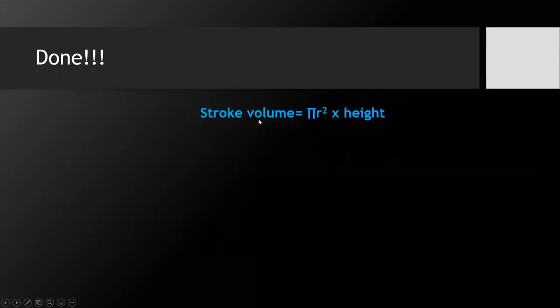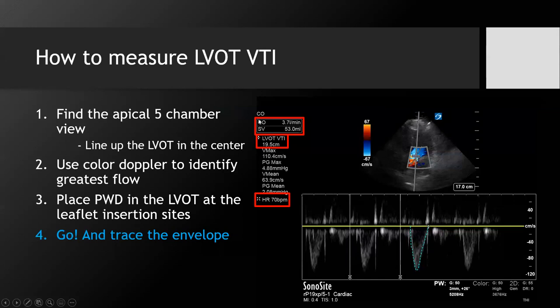Do you mind going back a slide? Do you mind if I ask a quick question? When you're looking at this pulse wave Doppler diagram, if you're seeing fuzzing out, where the curve itself is broader in some points, does that say anything about the quality of the VTI? Because in theory, if the pulse wave Doppler is directly at one specific point and it was the velocity of that point, it should just be a line. Is there any concern with it being more fuzzy, or does that question make sense?